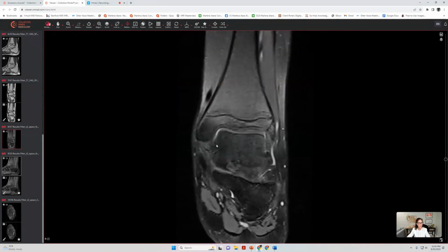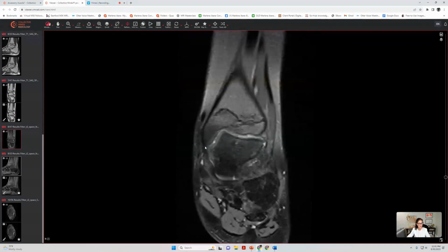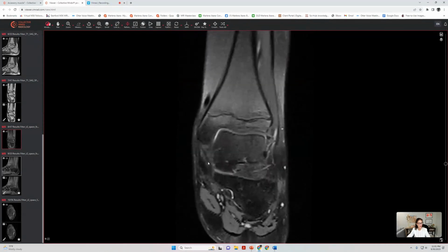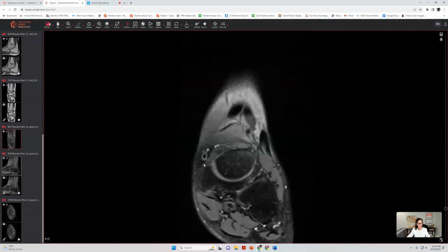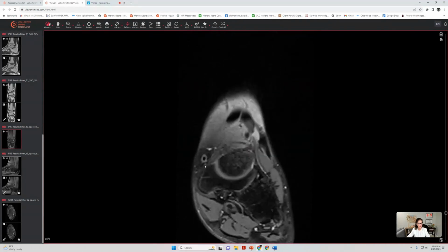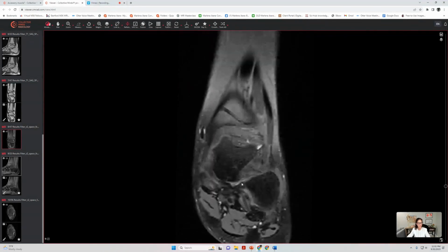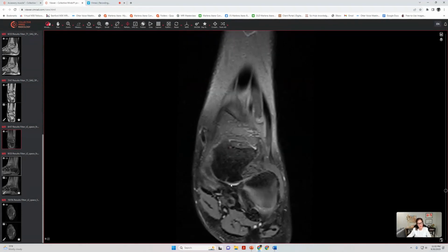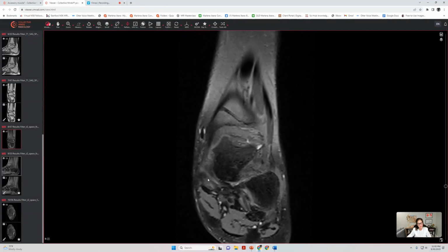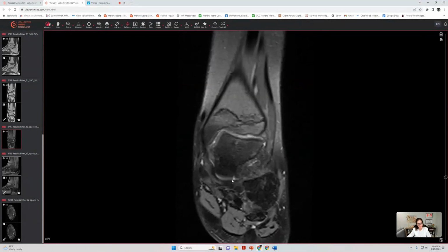Medial ankle ligaments, we can see the deep deltoid, superficial deltoid superficially towards the tibiospring, or if we move out towards anteriorly towards the navicular, we can sometimes appreciate the tibionavicular on the coronal image, and of course the tibiocalcaneal seen more posteriorly. And then of course we can see underneath the talar head the fibers of the inferior medial plantar and superomedial band of spring ligament holding our talar head.